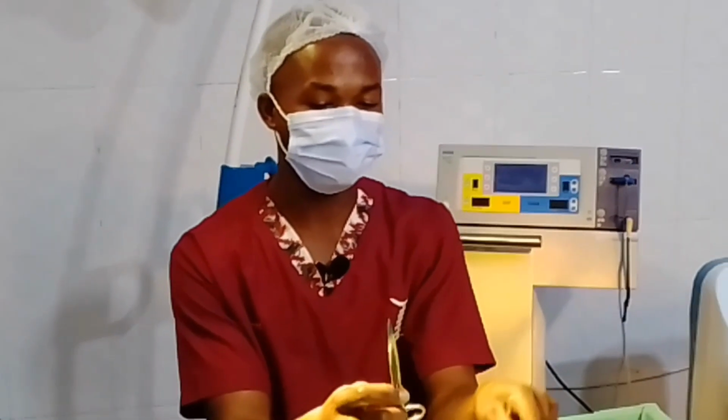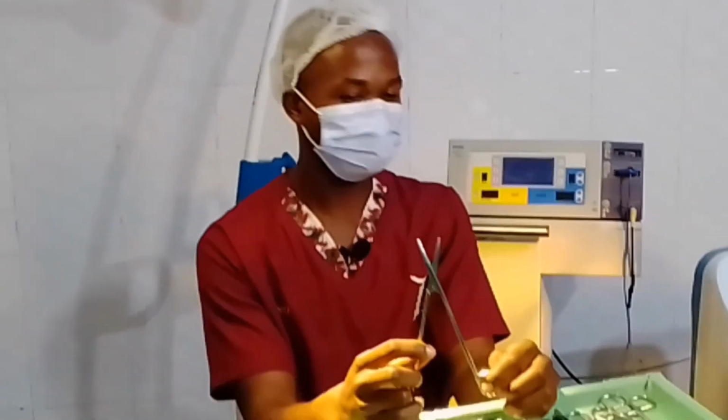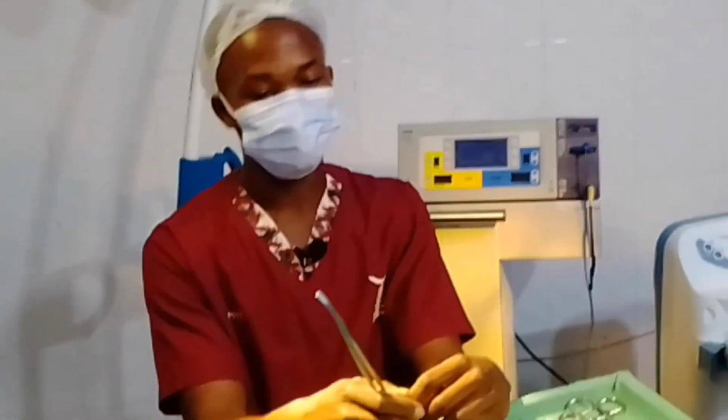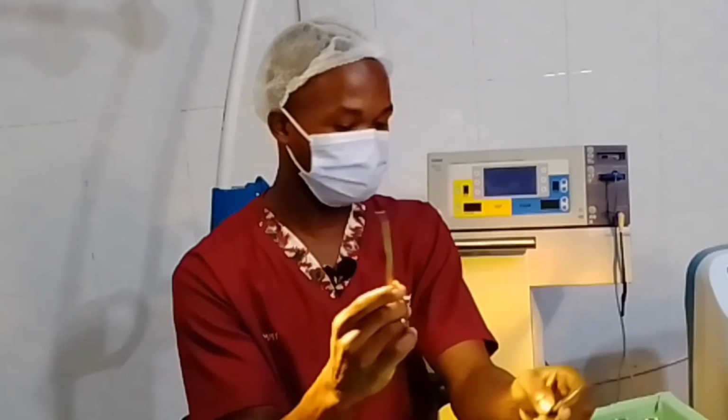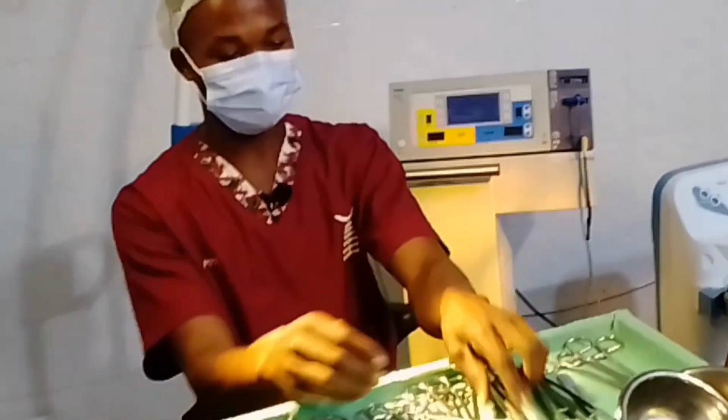This one is the Metzenbaum scissors. Good. We use it to cut soft tissue, delicate tissues. Another name is surgeon scissors. You've been hearing people saying surgeon scissors.